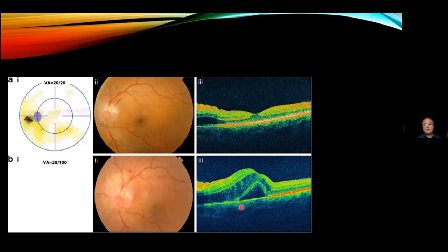So if you just look at this, you might say, oh, the patient's got a retinal detachment, I need to go and operate it. But if you start examining the patient, you'll see that the optic nerve is severely swollen, and you've got these hemorrhages on the side there, and the blood vessels are congested, and this swelling increased from there to there.